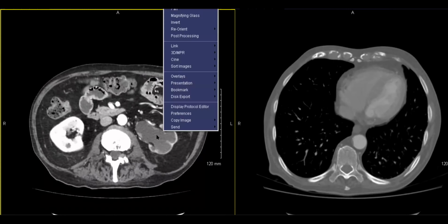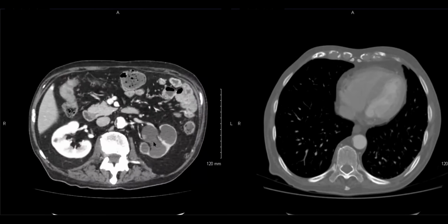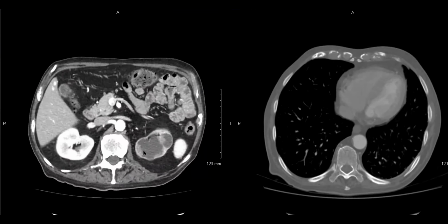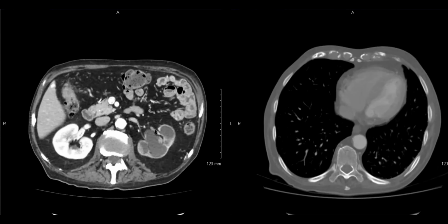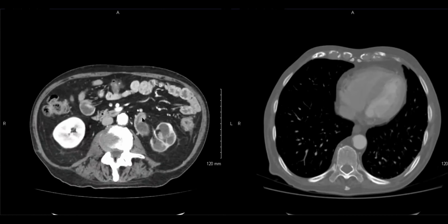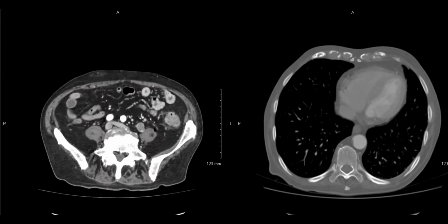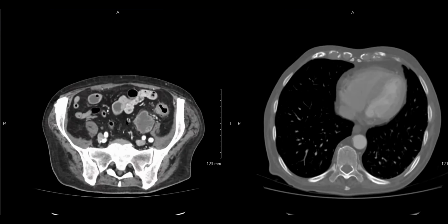Yeah, right. And you can actually see the entire urothelium, the collecting structures, and the right ureter. It just started, and you can see the bladder. So he has this just horrible TCC, and he was an inpatient.